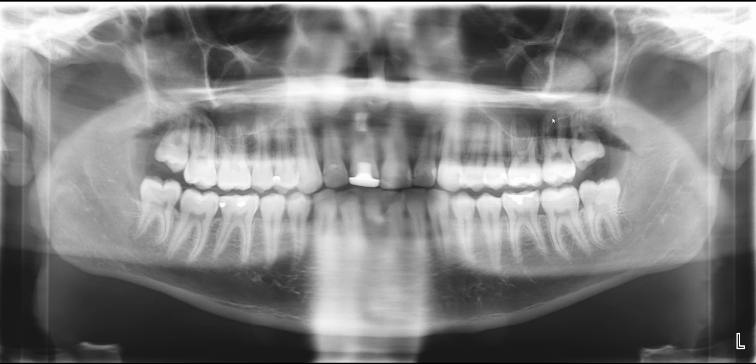So I think I've delineated all the important radiographic features. So this is an example of a mucus retention pseudocyst. As the name suggests, pseudocyst, it's not a true cyst. It does not have an epithelial lining, and it's a mucus retention pseudocyst.